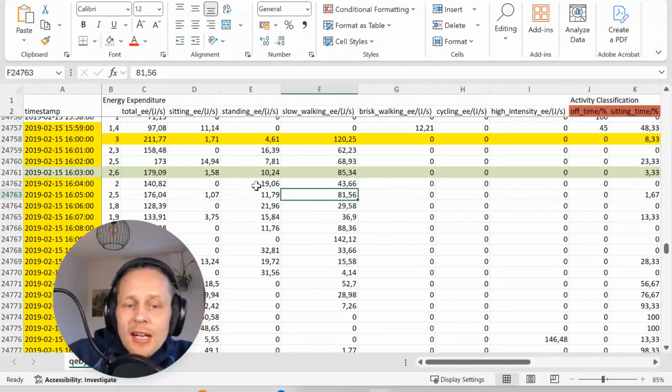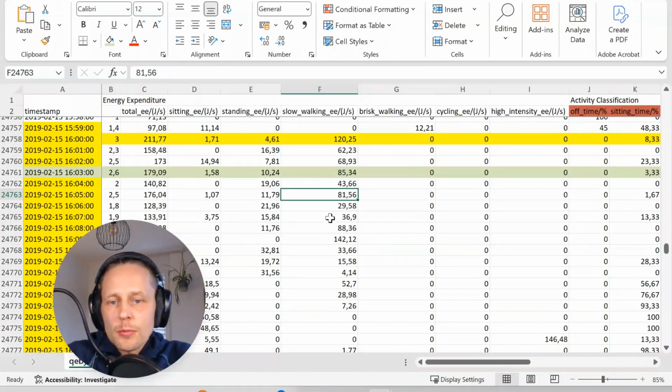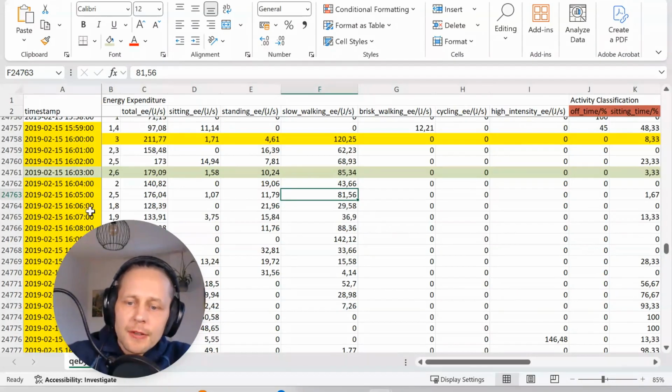So in this video, I have explained now how to export this minute by minute data. I will have a link here for another video where I will show how you can get the data from the reports as a CSV file for the analysis. That's useful if you don't want to go as granular as here, but get a little bit more summarized data, so it makes your analysis easier, and there are slightly different variables when we do it this way.